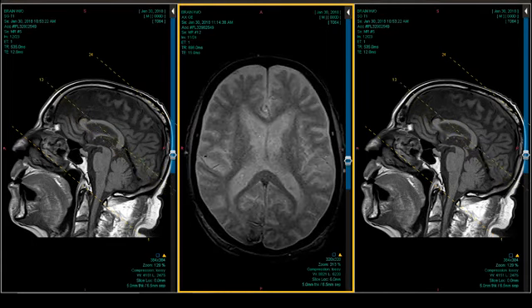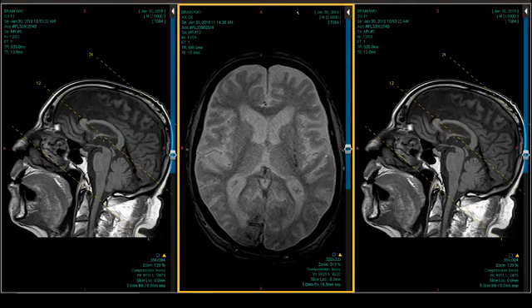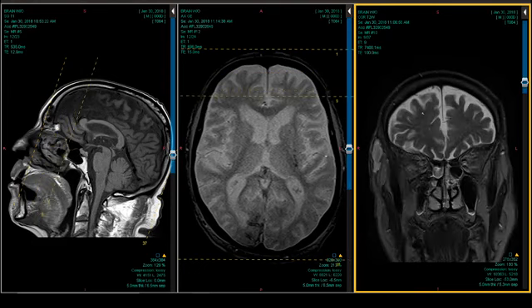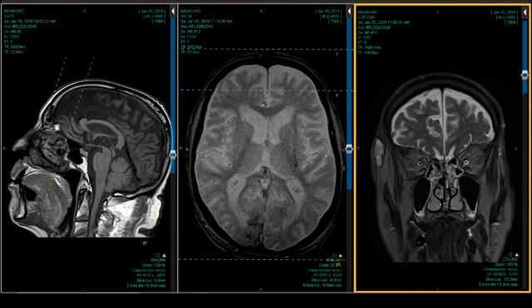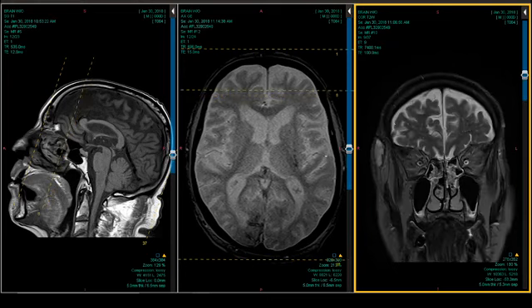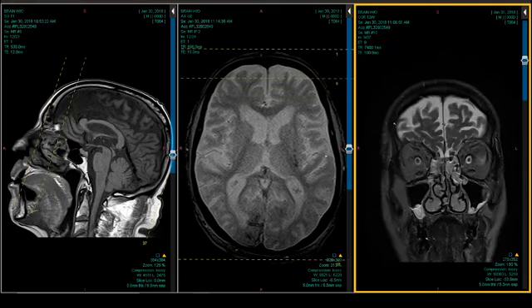Okay, dementia and gait disturbance. Dementia and gait disturbance. So, not that helpful. Very weird-looking lesion right here. Must have fallen down, maybe. Yeah, there was a fall. So on the right side. Don't mean to steal your thunder. I know you're scrolling, but it just popped out.